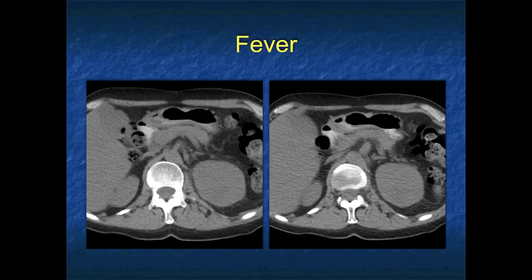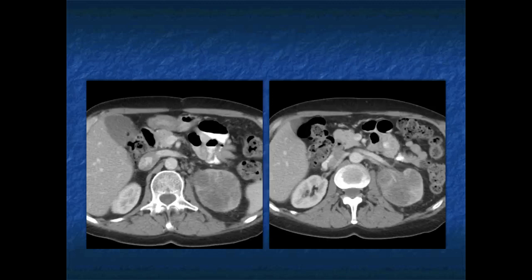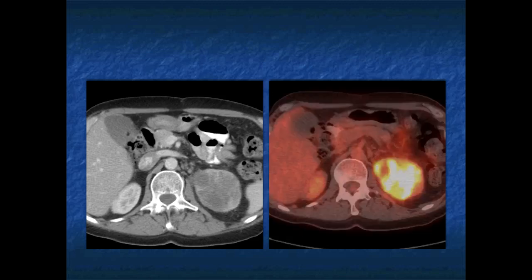Okay, patient with fever. The left kidney looks funny. Now, I'm not showing you the entire right kidney, but the left kidney looks funny and there's patchy enhancement. Again, you're going to say pyelonephritis, infarction, or something infiltrating. You've got to look at the entire kidney. You've got to think about possibilities. Lymphoma might be a thought. Maybe it's an infiltrating transitional cell. Maybe it's a renal cell carcinoma.